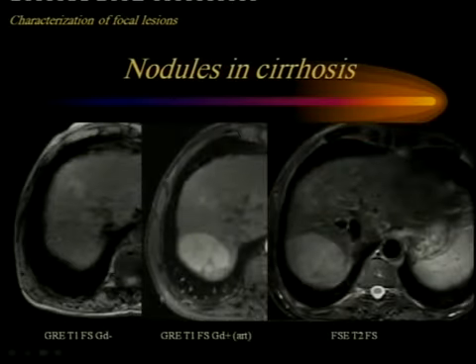Some examples of that is for this lesion in a patient with cirrhosis, where it's bright signal or moderately hyperintense on the T2 weighted sequence. On the T1 weighted, it's very mildly hypointense, and you can see the intense arterial enhancement on the post or on the dynamic scan.